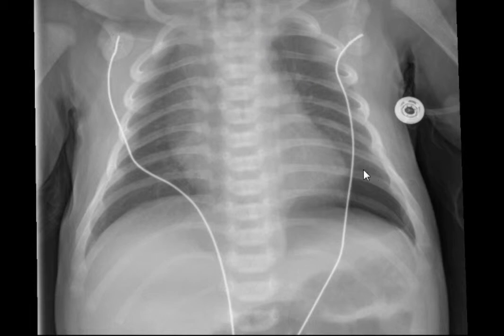Because of the sharp angle of the edge of the lung here, sometimes the air pushes up against the rib cage and the air gets caught under the lung. Often if you do the contralateral decub, in other words, if you did a left lateral decubitus, then you would see the air layer against the mediastinum.